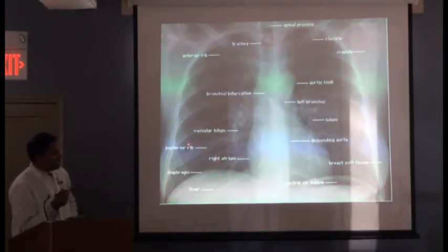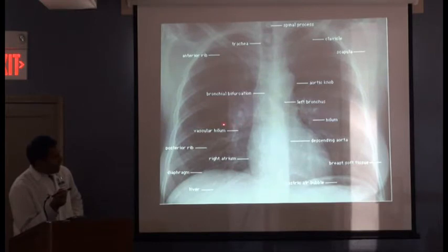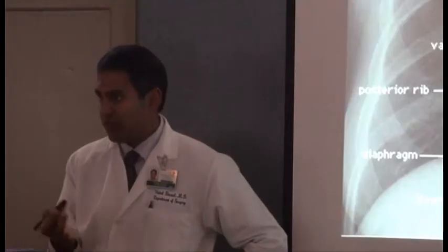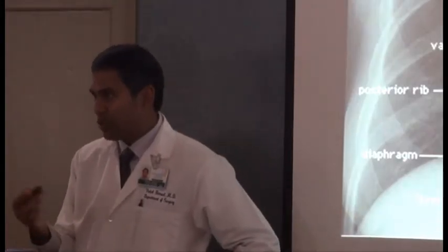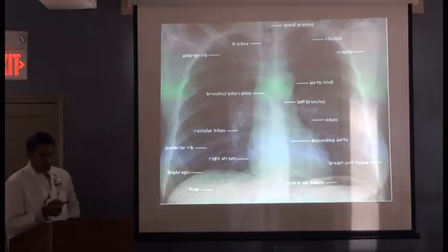Right? So this is actually the blood of the lung, the vascular supply of the lung. This is the hilum of the lung. And we look to make sure that the lung goes all the way out here. All right? So that's one way we can easily tell for a pneumothorax. That's one of the things we look for in the trauma bay. We look to make sure there's no pneumothorax. I look at the film, I look at those. All right, so C is circulation.